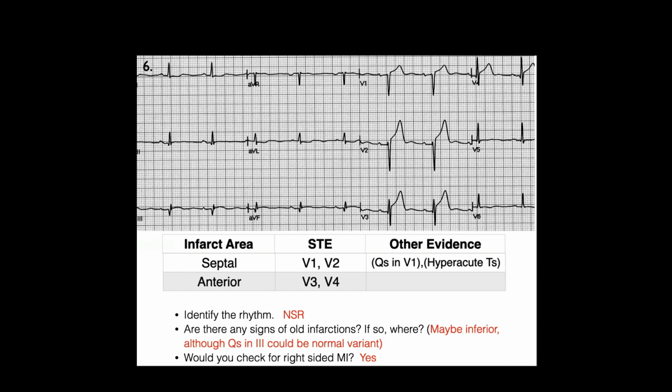The difference here is, remember when we talked about this, it's a little tiny QRS, and one of the criteria for a pathologic Q is greater than 25% of the total QRS. And that one definitely is. So it's actually 2 of them. The other thing is, for this size QRS, this is an enormous Q. So I suspect there could be an old inferior, but I wouldn't bet more than $2. That's about the importance I give it.